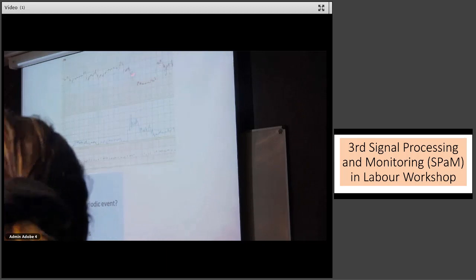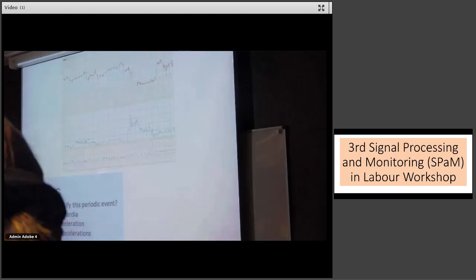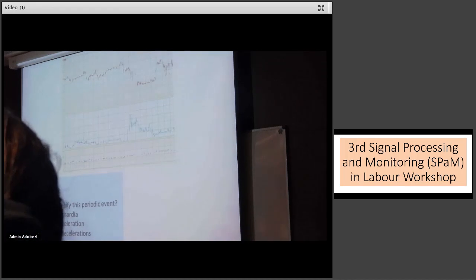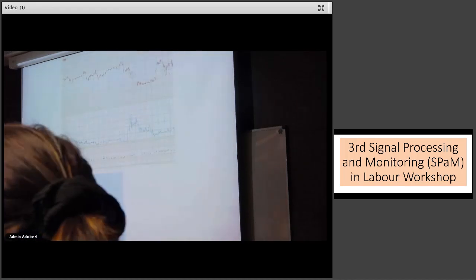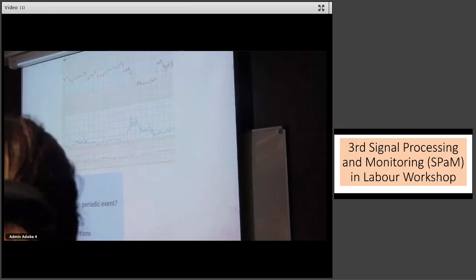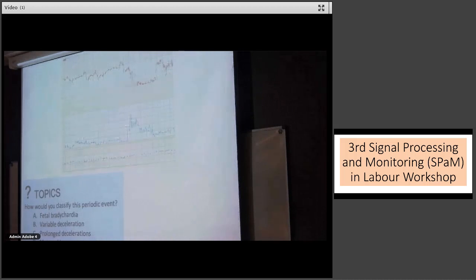Whose heart rate is this? It can be. Exactly. A serious question. But given what we're looking at, even though it's an electrode, it's still a valid question to ask, because there's a discrepancy between what the display is showing us and what the ECG characteristics are showing.